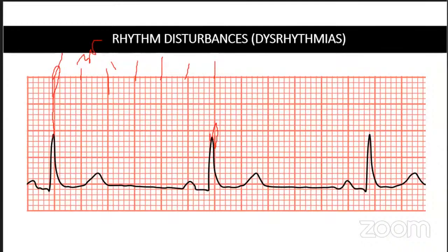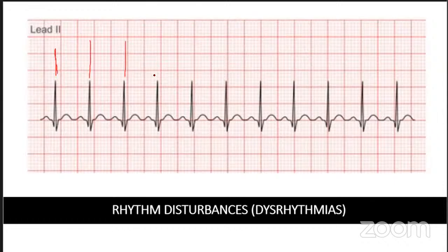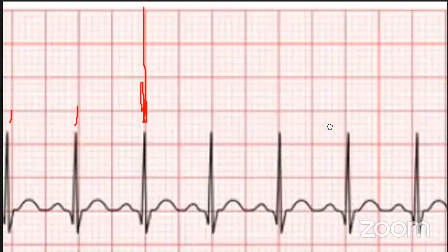Okay, just one more before we call it a day. How about this? What do you think the patient's heart rate is here? So again, you can see this doesn't fall on a tick line. This doesn't fall on a tick line. This doesn't fall. This doesn't, but this one falls nicely. This one also falls very well. This one falls perfectly well. So I can use this and then tell me what you think the heart rate is.